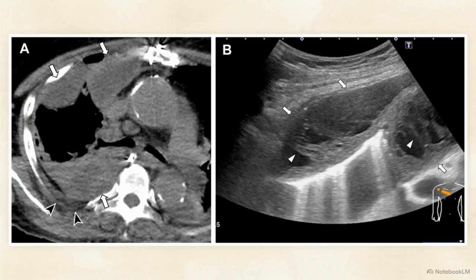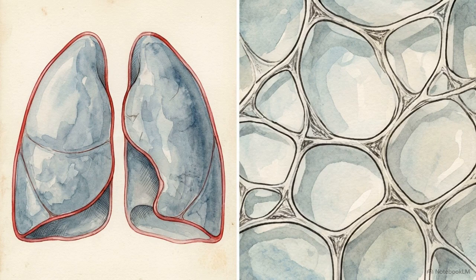Ultrasound reveals the internal structure of the infection. These thick, echogenic septations divide the fluid into compartments, which directly informs the drainage strategy. For fluid states, contrast CT identifies the inflammatory boundaries, while ultrasound reveals the internal septations that guide clinical intervention.